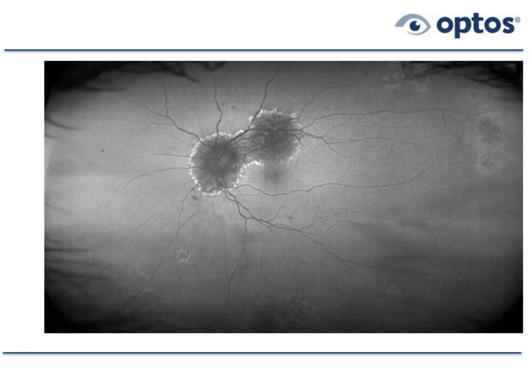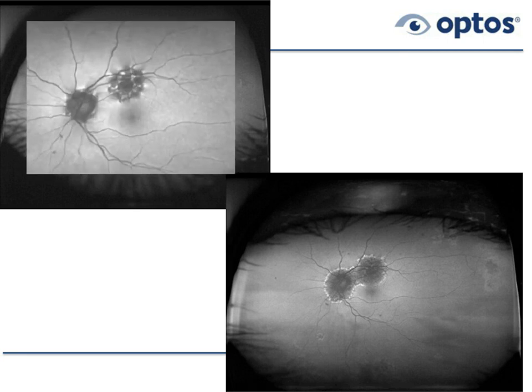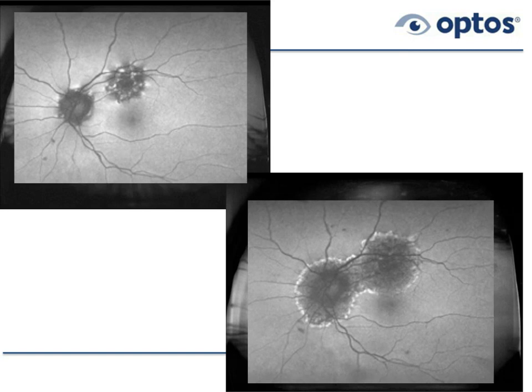If we look at this over this 2-month period, we can see in the upper left when the patient first started to complain, and on the lower right. And we'll look at that. So, dramatic change in a relatively short period of time. So this patient is now a candidate for being treated with one of these meds that may actually be useful for autoimmune diseases. And there are a bunch of them out there.